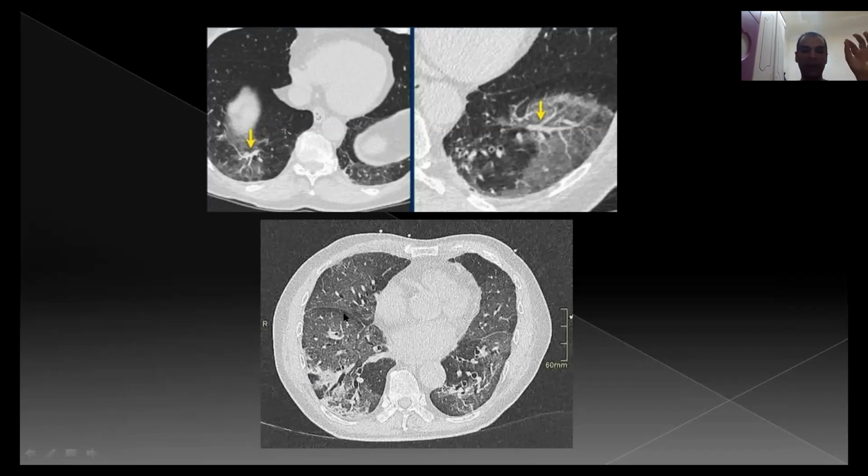Here, you can identify the bronchovascular markings. So it's ground glass. Here, it's normal. This is a normal lung parenchyma. This is a ground glass, but this one is a consolidative patch. Inside this consolidative patch, you should not see this bronchial tree dilated like this.